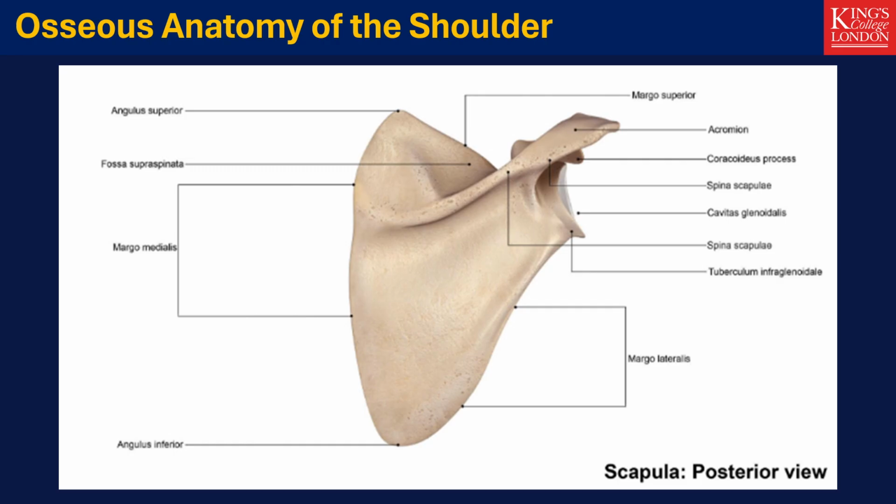The glenoid is shallow and relies heavily on soft tissue stabilization. The humeral head is retroverted approximately 20 to 30 degrees relative to the distal humerus, a key point when evaluating alignment. The acromion and coracoid form the superior and anterior osseous boundaries of the joint. The clavicle acts as a strut, maintaining lateral positioning of the scapula. Every shoulder radiograph must include a deliberate inspection of these structures before focusing on pathology.